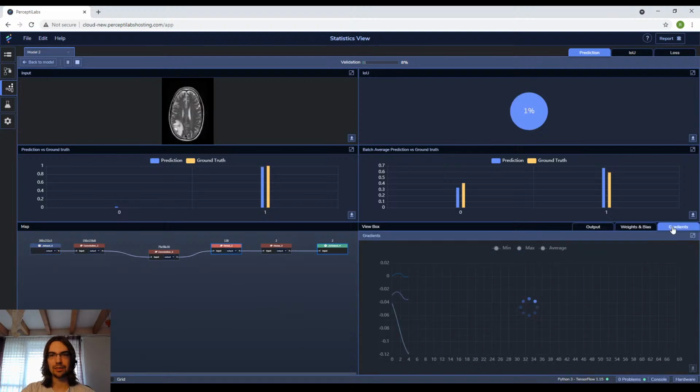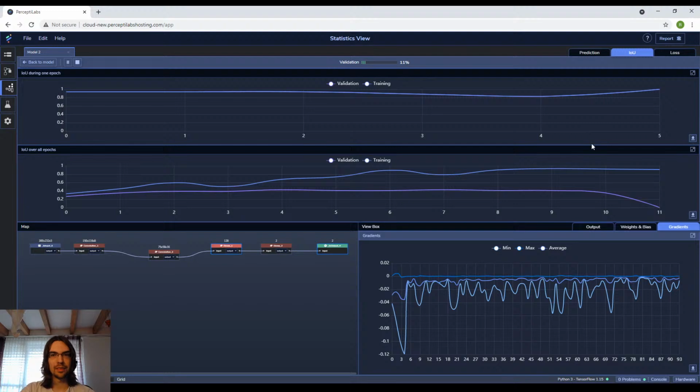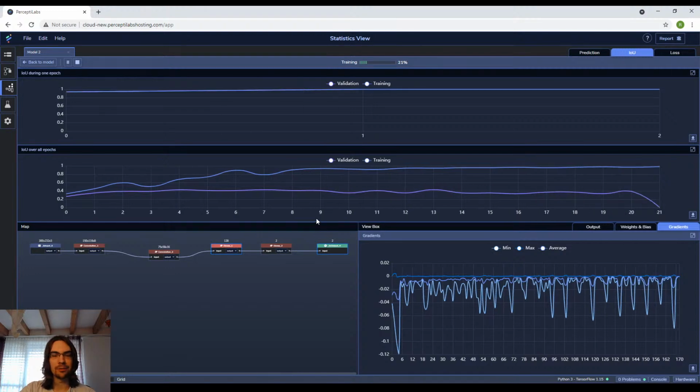But that's not always the case, so let's see how this one does. This one is a lot faster, is the first thing we can see. And it's already at 90% accuracy. Cool. So I think the stacked CNN might be the winner for this one.